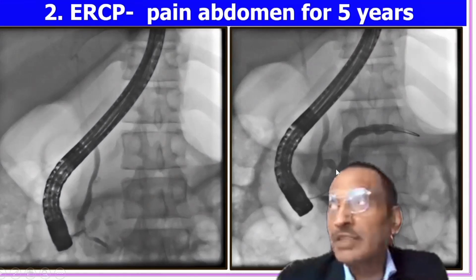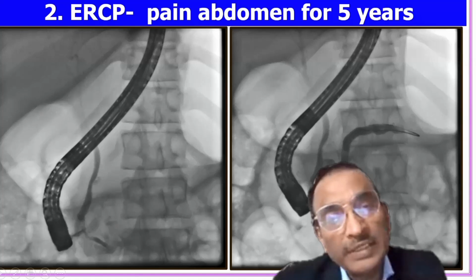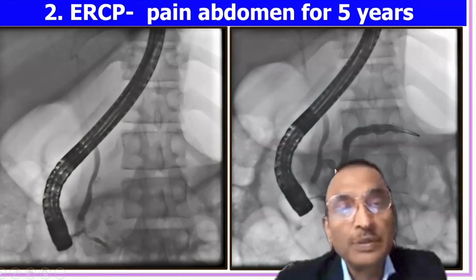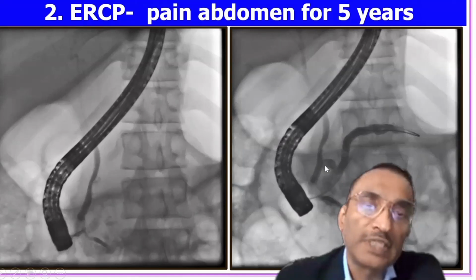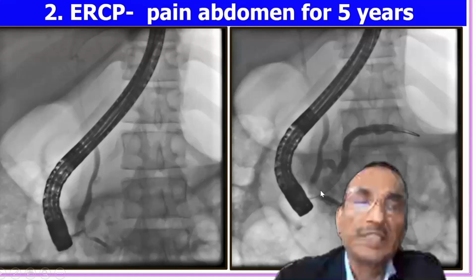Normally, you remember the duct of Wirsung and then the duct of Santorini, and the two join. So in chronic pancreatitis, it is possible that this duct can be very prominent. And sometimes what happens is that during the MRCP examination, it will be reported as pancreas divisum. So that is one of the fallacies of MRCP. It was actually reported as divisum, but this is not pancreas divisum. This is chronic pancreatitis with a dilated duct. And here you see carefully, there is a filling defect.